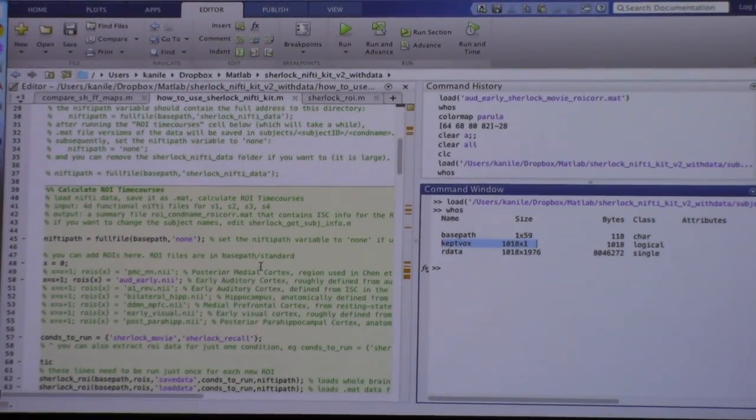And then you'll see a normal-ish looking distribution that is the luminance values inside of the brain. You want to pick a threshold at the bottom of that distribution. Then if you go back and look at your functional image overlaid on the anatomical image, you'll see that's where the brain is, basically where the skull is. So that's how you should threshold your data.